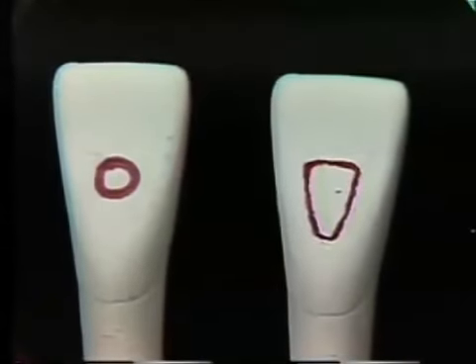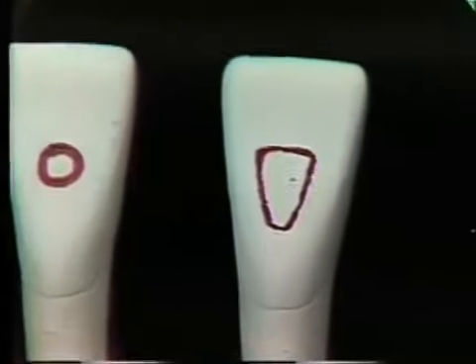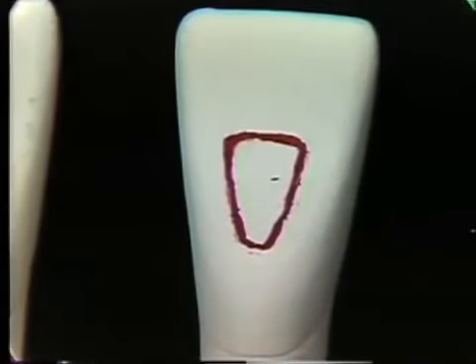I hope you chose the one on the right. You notice from the radiograph that the pulp was very narrow, but the crown shape tells you that it's a triangular crown shape much as the maxillary central incisor was, only the tooth is very long in a labiolingual direction. So the outline form of the pulp will be somewhat triangular, very narrow mesiodistally, and very long labiolingually.